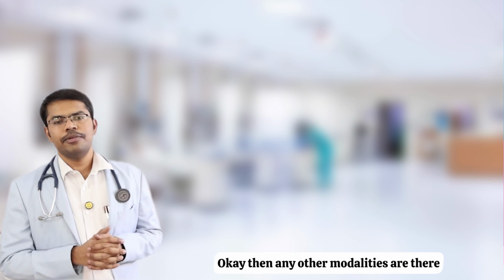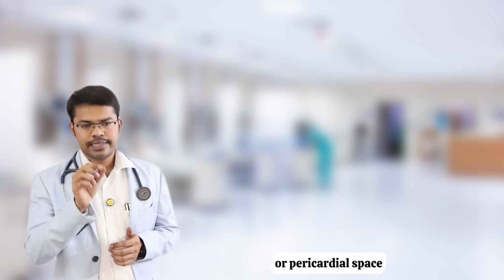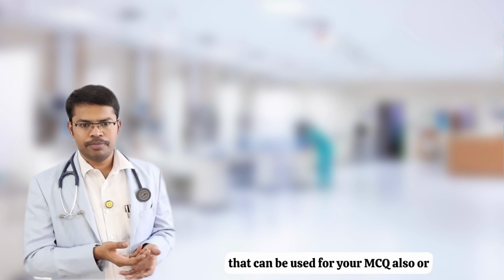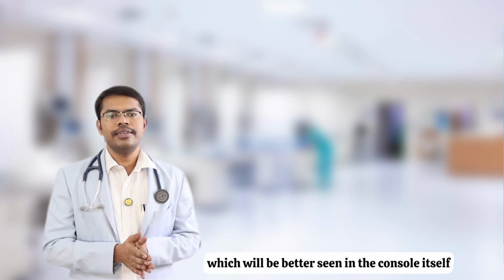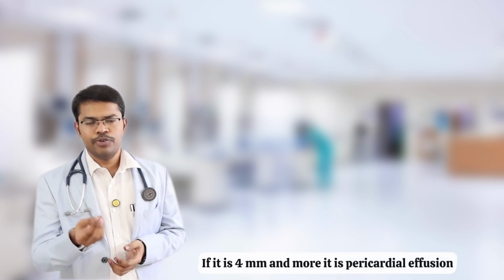Okay, then are there any other modalities? CT and MRI are there. If the pericardial thickness or pericardial space is more than 4 mm, that is a criterion that can be used for your MCQ also, or for clinically interpreting the image, which will be better seen in the console itself, or the radiologist will give the report. If it is 4 mm and more, it is pericardial effusion.